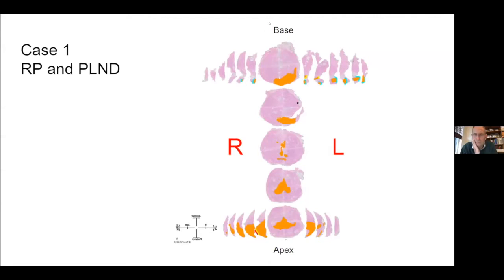Yeah, so this is the whole mount. These are the reconstructions. You know, there is no restriction due to the movement of fluid into vacuoles typical of the cribriform pattern, as you know. Okay, maybe this is my interpretation.